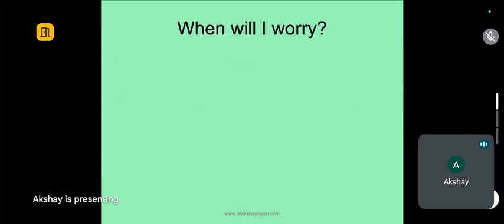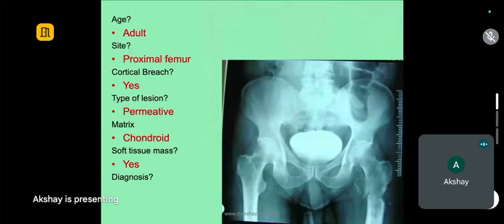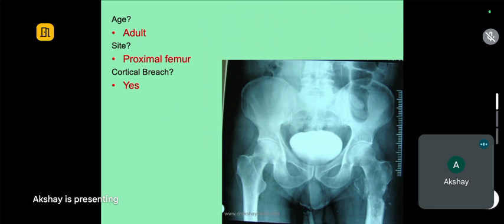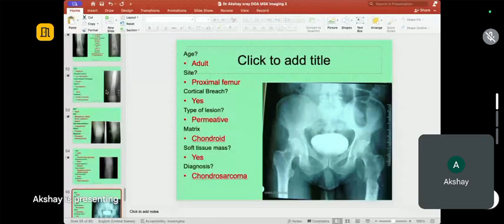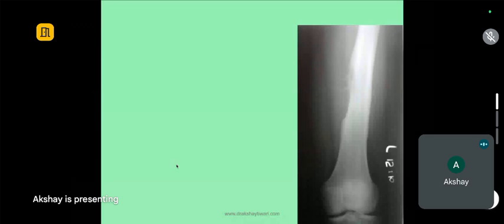So now I give you an X-ray, any X-ray, and you have to know how to describe that X-ray. How do you describe an X-ray? This is just a single view.